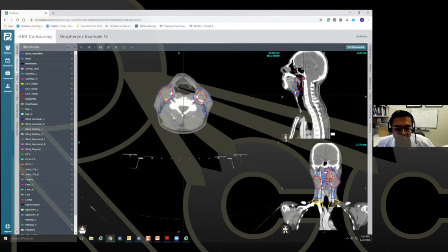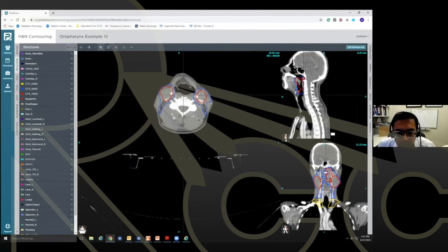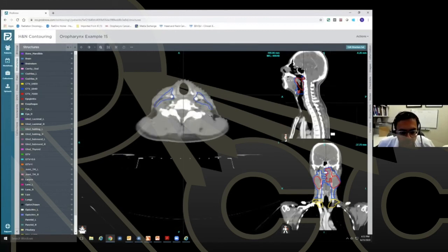You bring up a good point, Jason, that, again, these are guidelines, and sometimes they pick very model patients to show these, and you may extend sometimes into muscle to cover these spaces. All right, so now this is a case where, let's see, go to slide 69 here. So again, just showing how the expansion is more of the traditional expansion that we'd like to see beyond the CTV high into the SCM. So that was good. If we go down to slice 105.